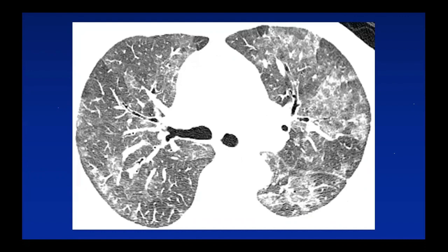Okay, so we're just winding down here. How about this patient? This patient is more unusual. There are three different densities. There's this density, which is darker, this density, which is intermediate, and that density, which is denser.